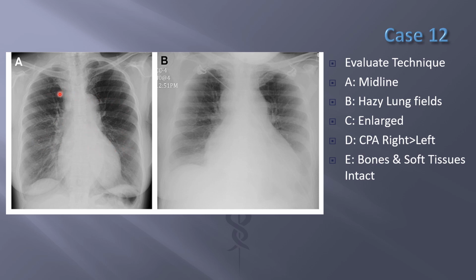So it's a normal finding. So the lung fields look fine on this side. Over here, again, I got some lung markings all throughout. Again, a little bit more hazy down here. Could be the breast tissue, more material to go through, I guess.